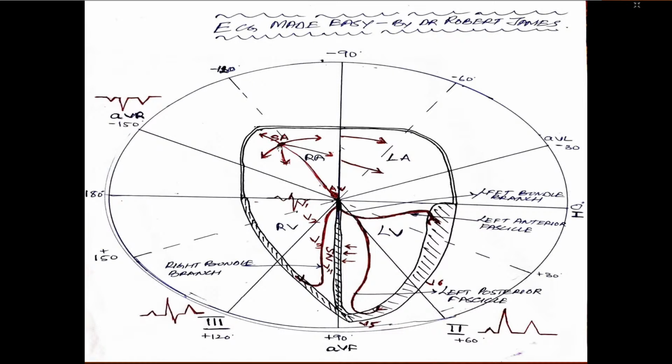So all the impulses, the complexes, are very positive in lead 2. So if you want to study P wave or QRS or T complexes, lead 2 is very good. And in V1, P wave is biphasic, as I've always said, and you can separate the right and the left atrial components. So it is very important for interpreting the changes, left atrial dilatation, right atrial dilatation, or biatrial dilatation, or atrial MIs. So in atrial MIs also we have to look in V1, V2, and other leads also.